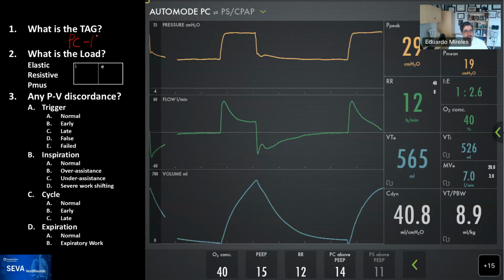This is essentially IMV, so intermittent mandatory ventilation, and it's type 2, which means that when spontaneous breaths appear, the mandatory breaths disappear, and it appears and disappears based on an algorithm that is a little bit more advanced than what we're going to discuss today, but it's for you to understand that when the spontaneous breaths appear, the mandatory go away.